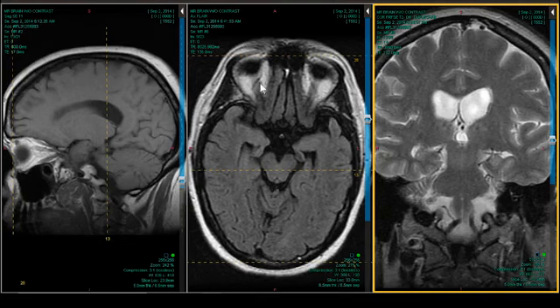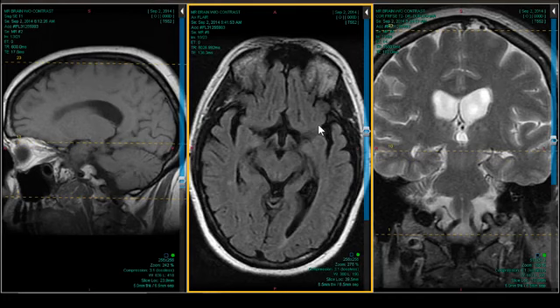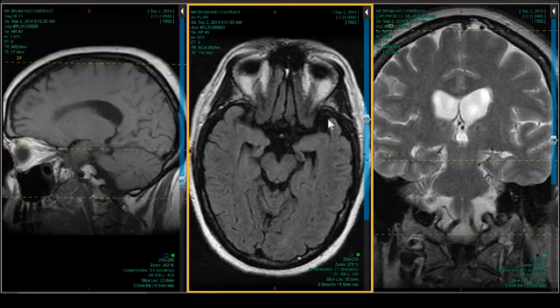You know, this triangle right here, where the olfactory area is atrophic, the orbitofrontal gyrus is atrophic, and the great horizontal fissure is so huge. That is a very typical pattern that you see in the Pick's variations, of which you heard there are now 3. They don't call it Pick's disease anymore. And it is more left-sided than right.